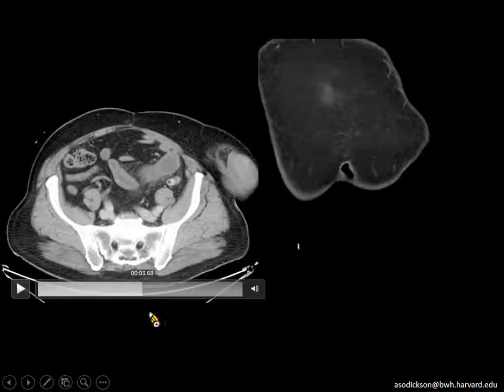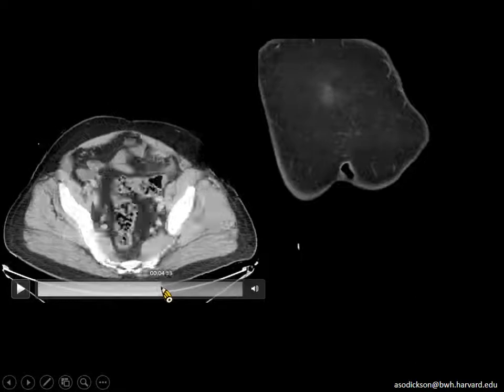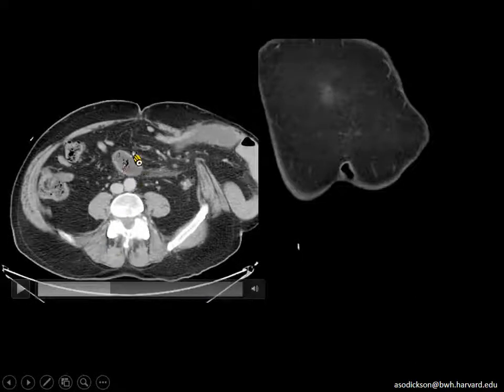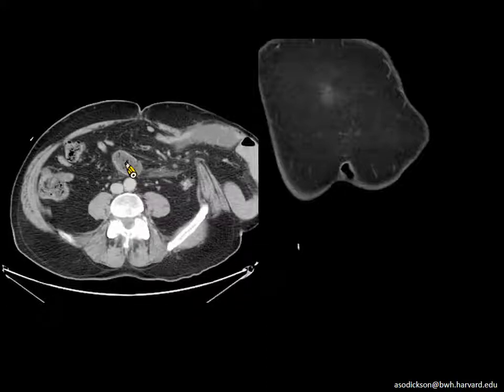So we pick a bowel loop, say we pick this one, and we go in one direction and follow it out and come in the other direction. And we find this bit here that has some fecalized contents. This is a very helpful sign. If you need to go quickly, you jump to the area that's fecalized, and more often than not, that is immediately proximal to the transition point.